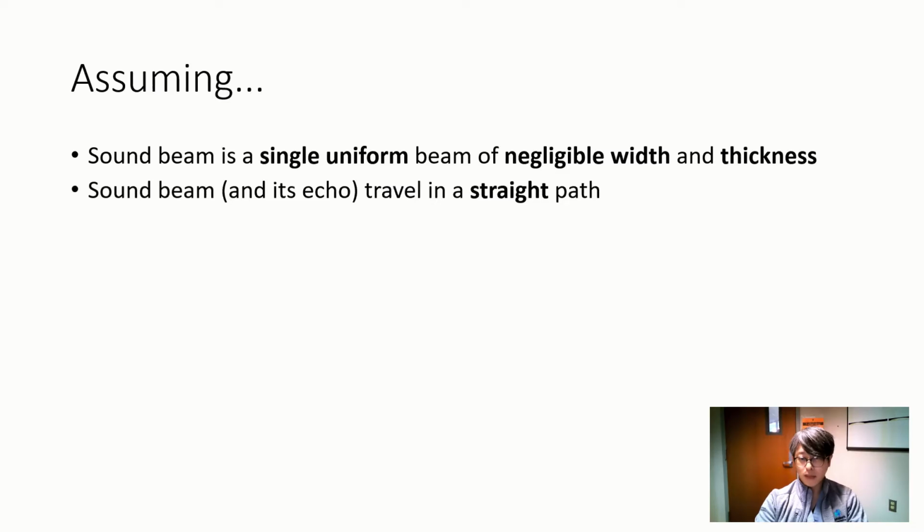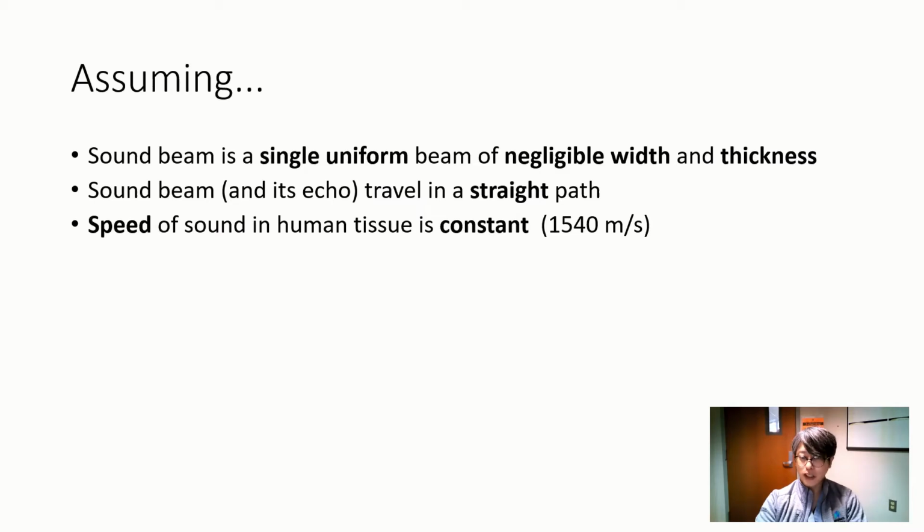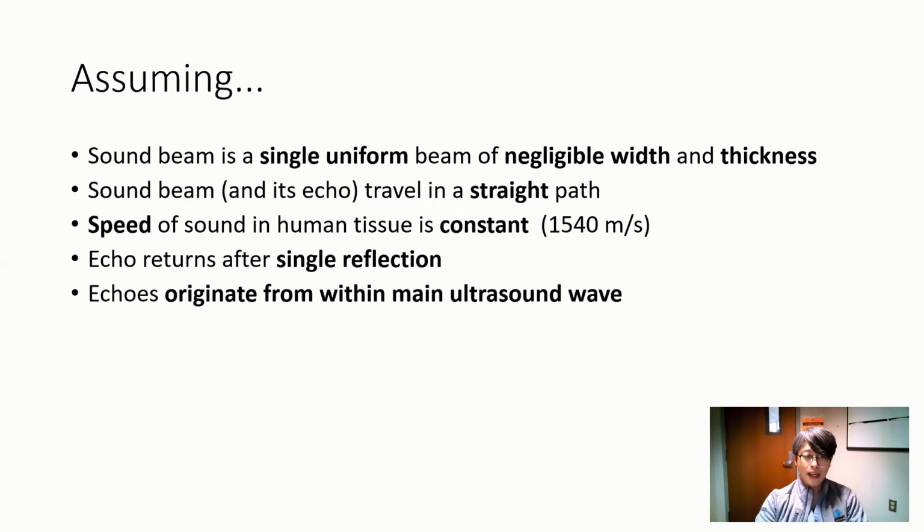The sound beam travels in a straight path, not a reflected or curvilinear way. The speed is also constant, and echoes return after a single reflection, not multiple reflections.